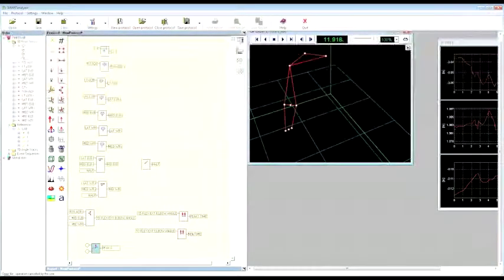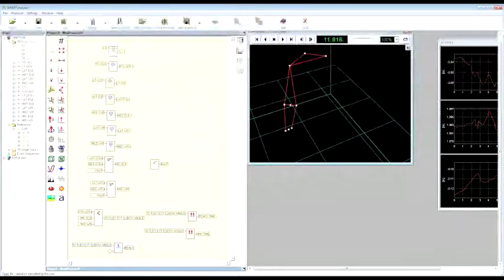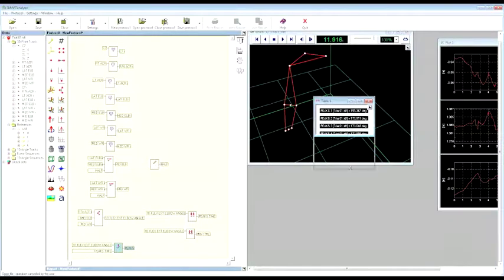Peaks is going to be the name of the output. In this case, the first input has to be the angle in time, and the second input has to be the event sequence. So I can have as a result the sequence of the maximum values of the angles. As you can see, now I have an angle.